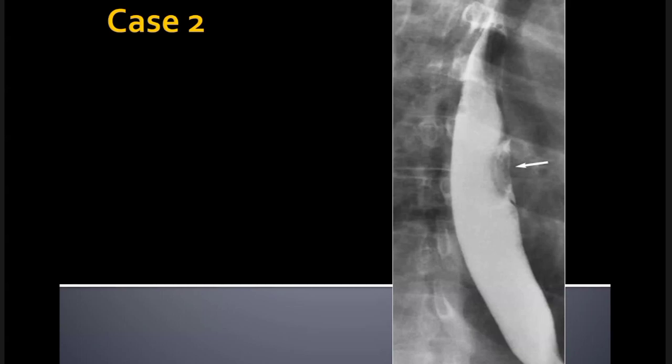Is there anything else you might like to know about the patient clinically? Patient's history, madam. Yeah, history. Here you've got a solitary ulcer, haven't you?